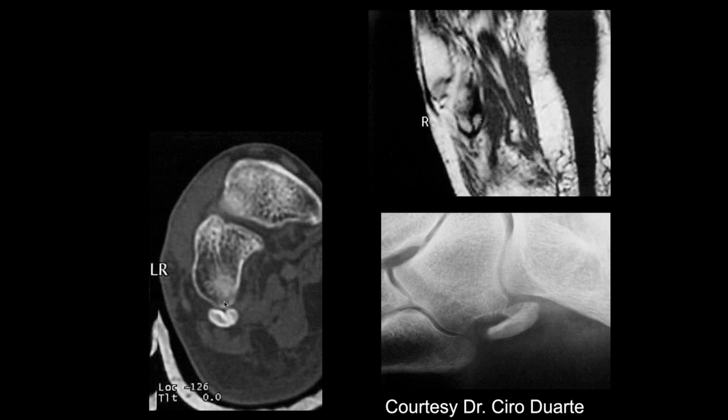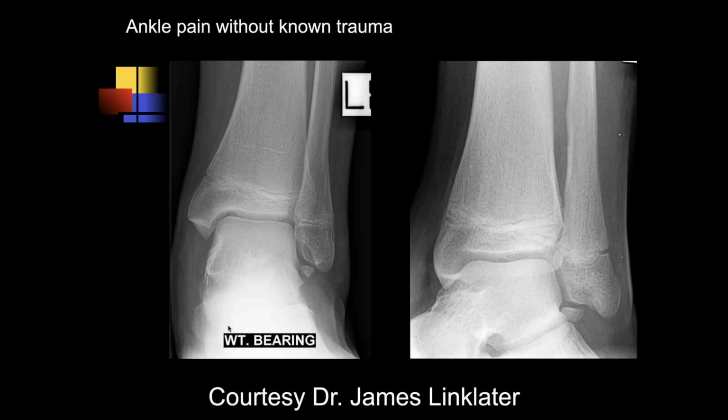So is this not kind of a similar finding, within the region of the peroneal tendon, with this smooth corticated bony fragment? Yeah, so this is a bipartite. We can see on the short axis it has two longitudinal corticated areas. They either developed as two, or it's an old injury, but there's nothing acute here, and no edema. Okay.